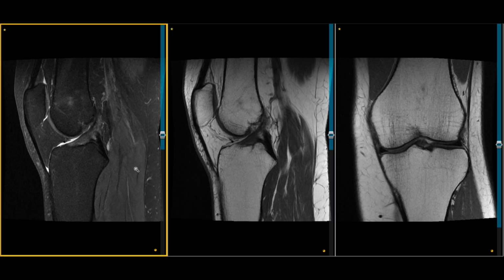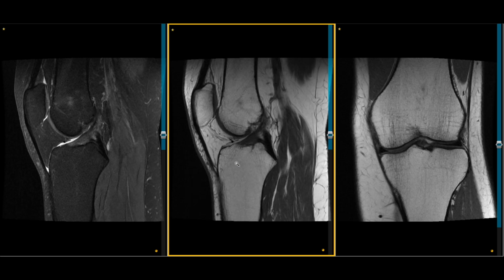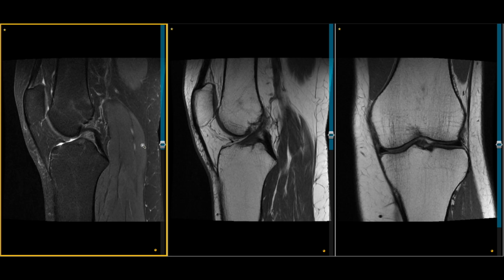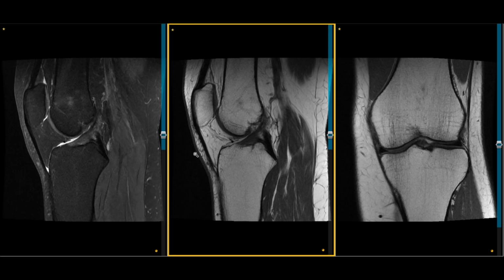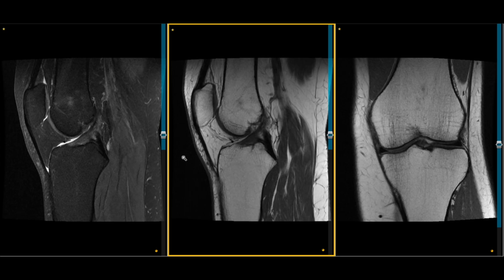When you come through to the sagittal images, which are more important to assess the trajectory of the ACL, one will notice that this ACL on both the PD FATSAT as well as the PD images appears to have a slight bit of a sag in the ACL. So this would be compatible with a normal thickness ACL heal with elongation. Now the elongation in this case is not extreme, but there are worse cases of elongation that you can see where the ACL would be even further deviated from Blumensaat's line.